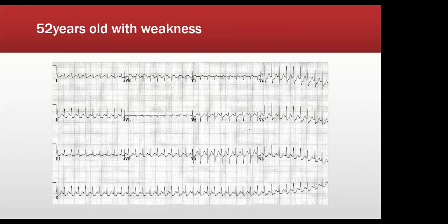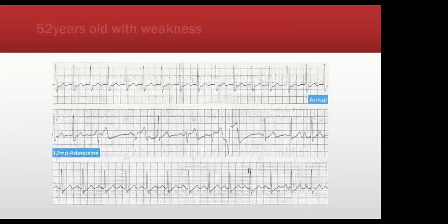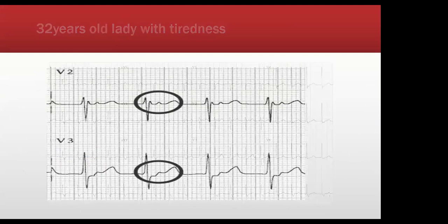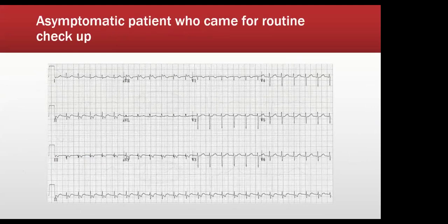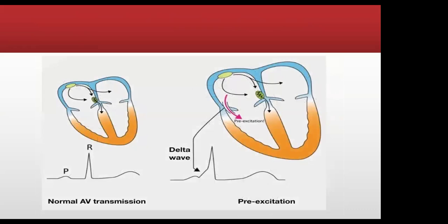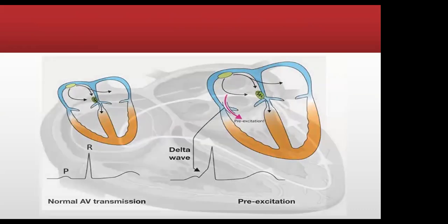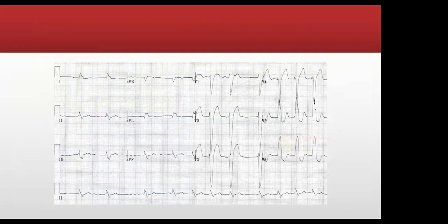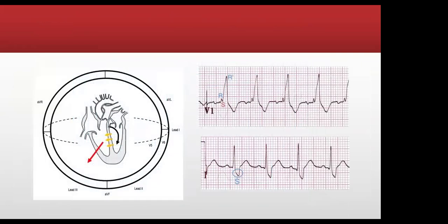Do you have anyone on Brugada? Brugada. I'm trying to look for it. I should have one, but I'm looking for it. Yeah, I don't. It's a difficult one for me every time. I think Brugada is simple to look at the history, and they tend to have different morphology. Easy for us.